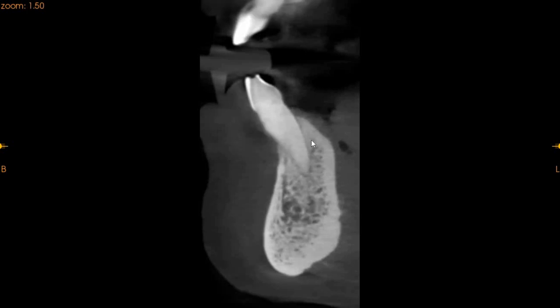We do see PDL widening, but we don't see any major periapical radiolucencies, and we see absolutely sclerotic canals in this region. The lower right lateral incisor has very sclerotic canals, and there is very little that we can see, a very faint canal right here, but it does seem to be absolutely sclerotic. Moving to the central incisor, the central incisor seems to have very minimal bone support. There is periodontal disease, PDL widening, and again in the central incisor, it seems to us that there are very limited and very sclerotic canals.